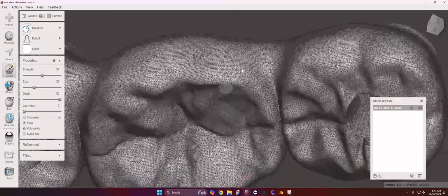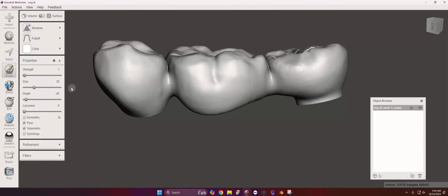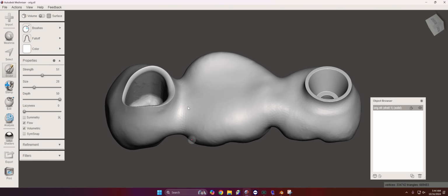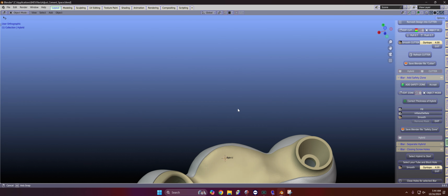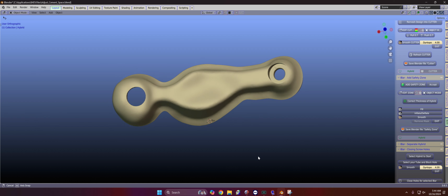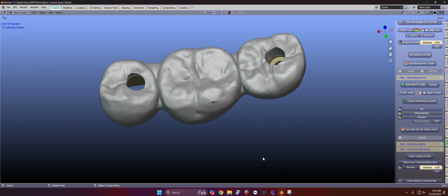I mean, how cool is that little feature to be able to solve that issue without having to go back to the drawing board and make a new custom abutment? Perfect. Absolutely perfect. And that'll allow you to bring it into B4D and segment out a bar on this thing, and really have a more secure way to the finish line to be able to do a bridge like this.